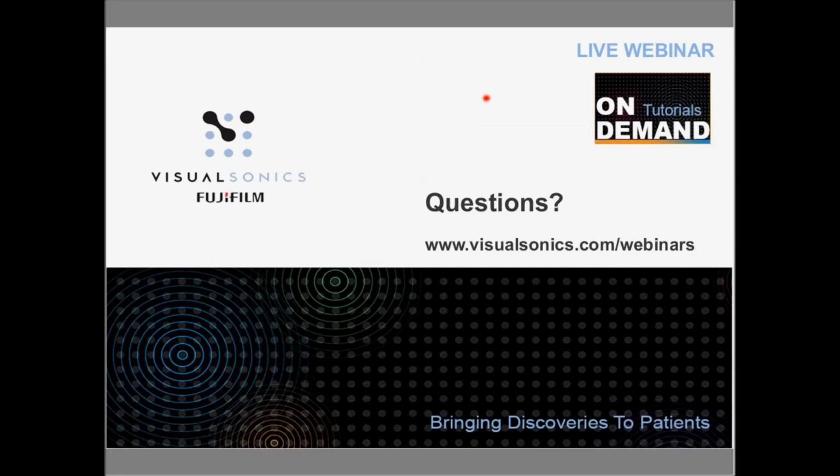ventricle. Well, if you're looking at an infarct model, plus or minus a millimeter in your plane of view, you could be off the infarct, on the hinge point between the infarct and hyperkinetic tissue, or right on the infarct, and you're going to get drastically different functional data from that measurement that you do based on all those assumptions. The long axis LV trace takes in a lot more of the heart when you're doing the measurements.